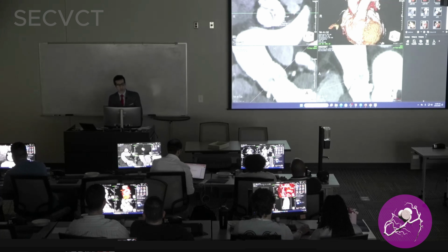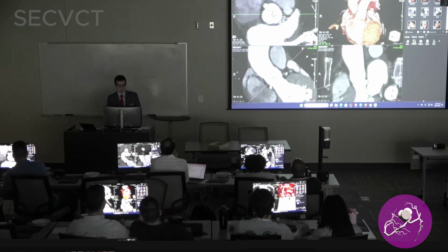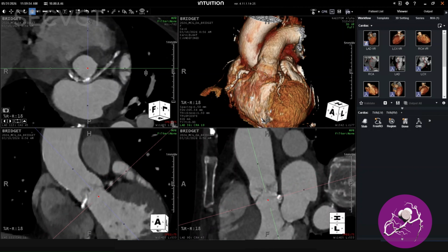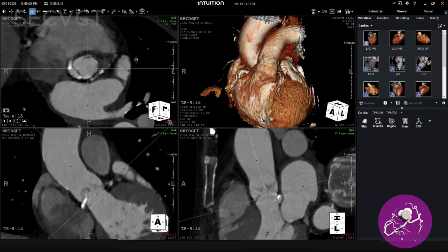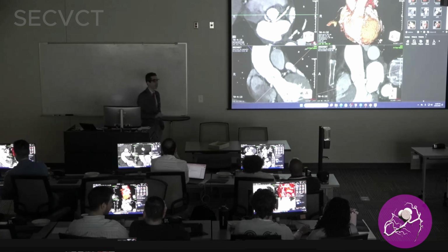And what I need you to pay attention to, and take your time, maybe 45 seconds, 60 seconds, is to tell me what's something you can see. It's like an incidental finding, cardiac related. Exactly. So there's a retroaortic course, good job, retroaortic course of the left main. Which sinus is it coming from? Good job, okay.